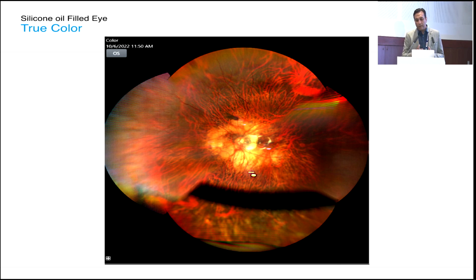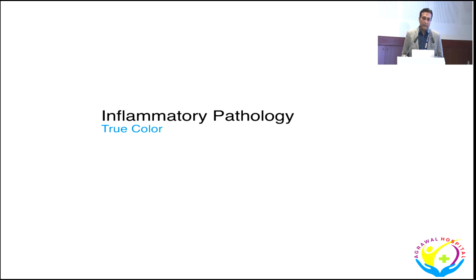So these are very interesting cases, when you are operating on high myopes or in choroidal detachment cases, and then you see in the post-op period. So this shadow is actually not an artifact. This is basically signifying the underfill of the silicone oil. And in these cases, you have to be careful to examine the inferior periphery in the follow-ups and to augment laser where needed, because these are prone to recurrences because you have an underfill of silicone oil in these cases.